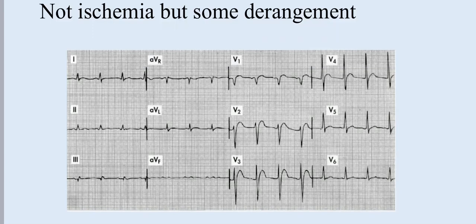The T wave itself isn't short, but the ST segment has actually vanished. No ST segment. The T wave is just hugging the complexes right away. So this is where hypercalcemia acts. It eliminates the ST segment and brings the T wave closer to the complexes. And when the T wave gets fused with the complexes, you have the feeling of elevation. But this is very characteristic of hypercalcemia. Okay.